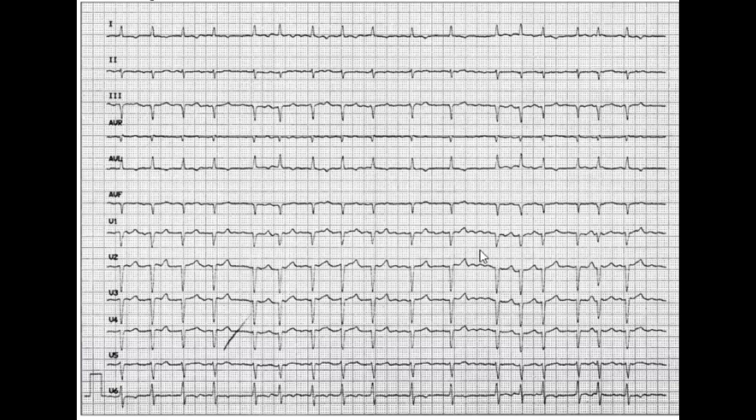If anyone wants to solve this ECG, it's ECG number 27. I should have mentioned that in the beginning. I'm so sorry, but this is ECG number 27. And if you see the Q waves in the QRS complexes, you can clearly see Q waves in lead 3. They are pathological Q waves in lead 3 and lead AVF. I think also you can see it in lead V1, V2, V3, V4. Yeah. So you see Q waves in lead 3 and AVF.